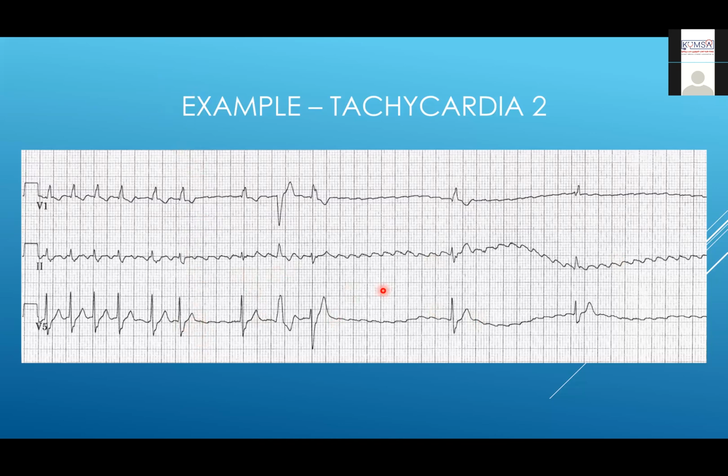The QRS slowed down, and then that sawtooth pattern showed up. What was he given? Adenosine. Adenosine, yeah. That's part of your ACLS protocol for SVT. I'm not sure you guys do ACLS in the UK. I think it's a different type of course. Okay. So it's atrial flutter.